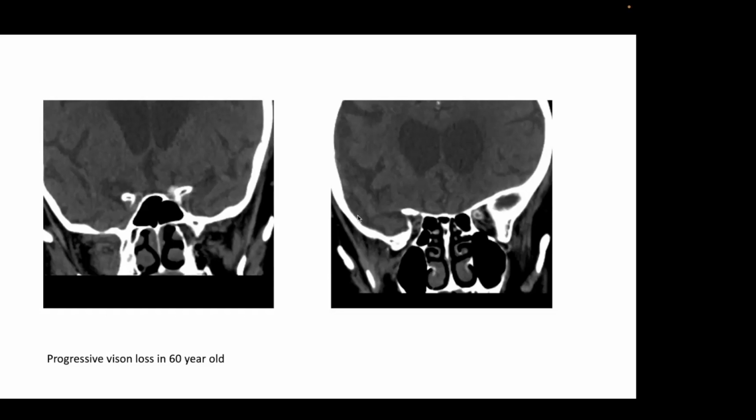Sometimes it's hard to tell the difference on CT. Calcium, right? So it could be calcification, calcium. Yes. It could be blood. Yeah. So we're pretty sure. I didn't give you all the imaging, but we're pretty sure this is actually calcium. And you see the way it conforms to the margin of the optic nerve at the periphery.